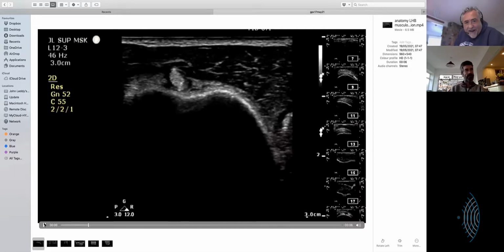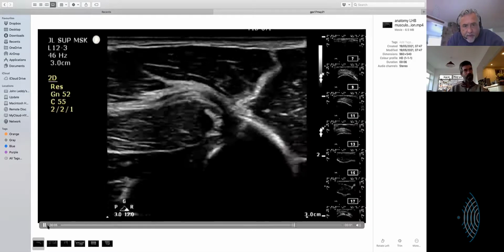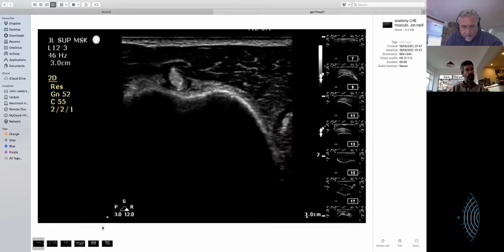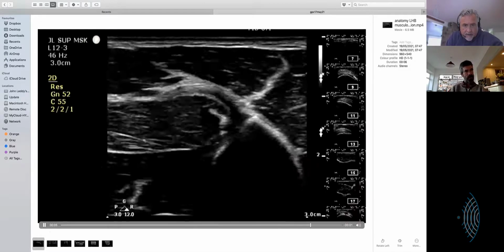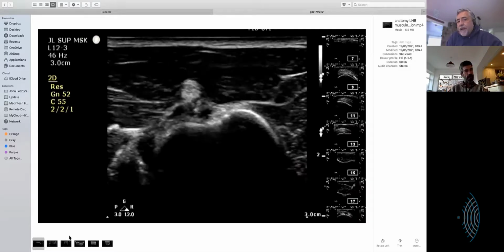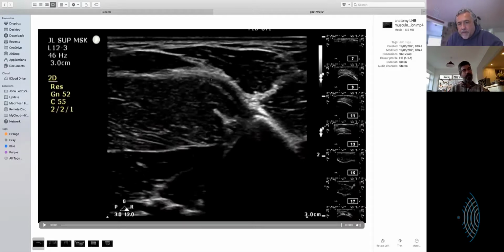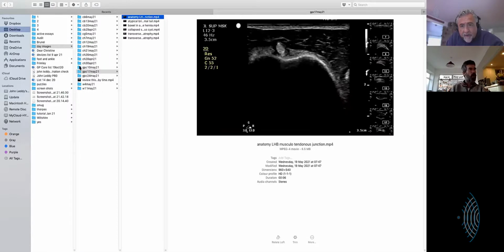Yeah. All right, talk to me. Is this a long head? Yep. A very normal one. Very slim patient. I just quite liked this. It was brighter when I was actually scanning it. I just liked the way you could see the musculotendinous junction developing. Yes. So I just thought that you're dropping inferior through pec major down to where it's actually becoming the biceps muscles. Yeah, I just saw that and thought, oh, that's quite nice.